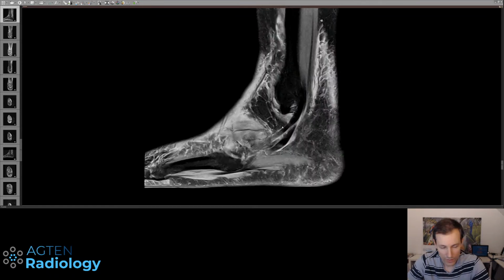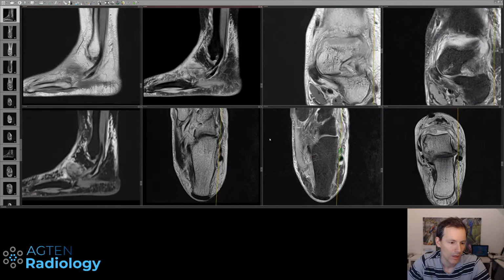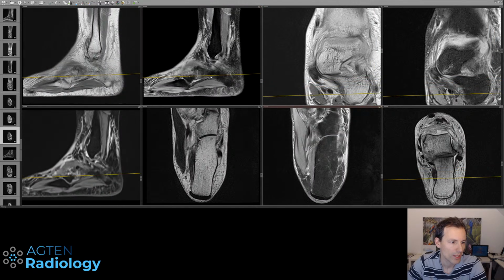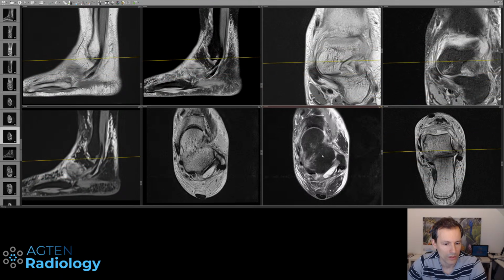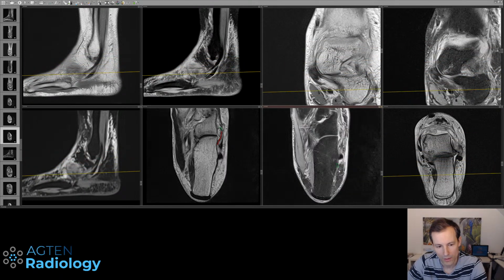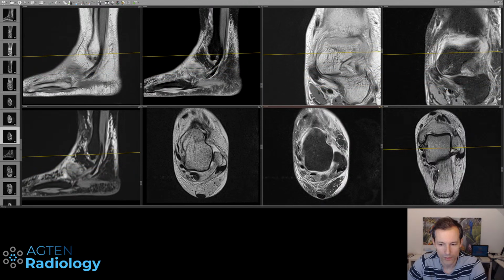And if the injury was 2 days ago, then I wouldn't talk about a tenosynovitis. I think it's just bleeding inside the tendon sheath. So it's probably just blood there and not really inflammation in the sense of a tenosynovitis, which, if it's a few weeks after trauma and you still have fluid, then I would probably say this is tenosynovitis of the tendon sheath, which can also happen of the peroneal tendons after an injury, and is quite frequent, associated with tendinopathy, etc.